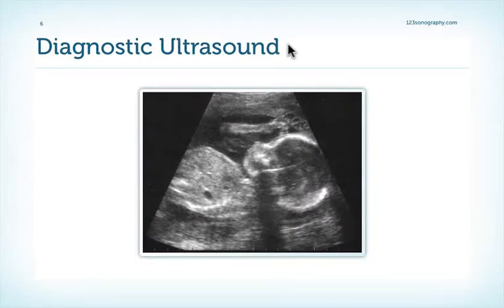And here's a beautiful example of an ultrasound image. You can see again the shape of the sector, a curvilinear array probe, and you can see that there are light and dark areas. The light areas, or the white areas actually, are those areas where we have a lot of reflection, while those which are dark don't. Thereby we can really distinguish tissue from each other. Tissue which has a lot of echogenicity and tissue which doesn't.